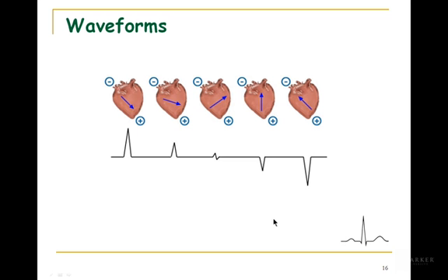Okay, so having an idea about that is important, because sometimes we may see something like inverted P waves. You say, wait, I'm not supposed to see an inverted P wave. That may happen. As long as you know you put your electrodes on correctly, it can indicate something's going on in the heart. If we go over what certain voltage should be, how it should look, if it doesn't look that way, then you need to start figuring out what may be going on.